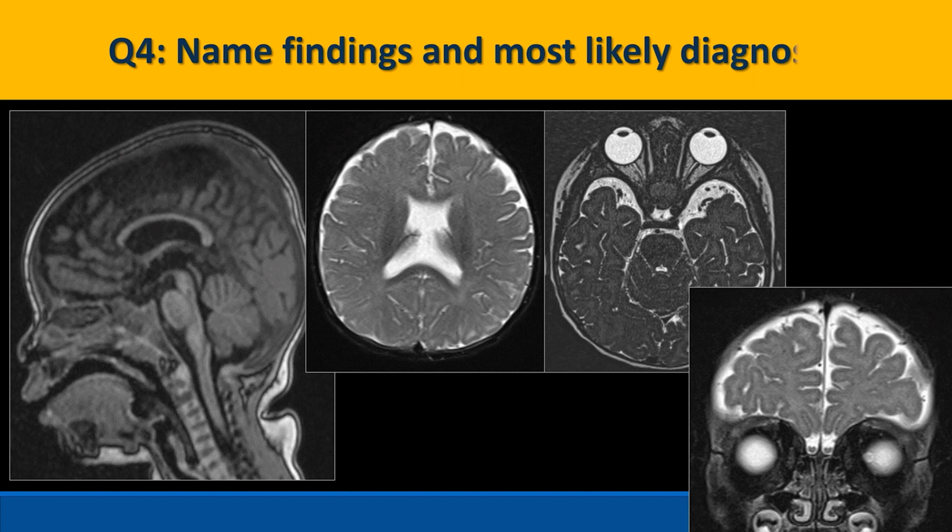I think that's fair because you cannot see the anterior and posterior gland very well. Every time you don't see those things very well, it may be absence of the posterior bright spot. So what next do you need to check for? Try to follow and see if we can see a component along the infundibulum or hypothalamus, which at least on this image I don't really see.